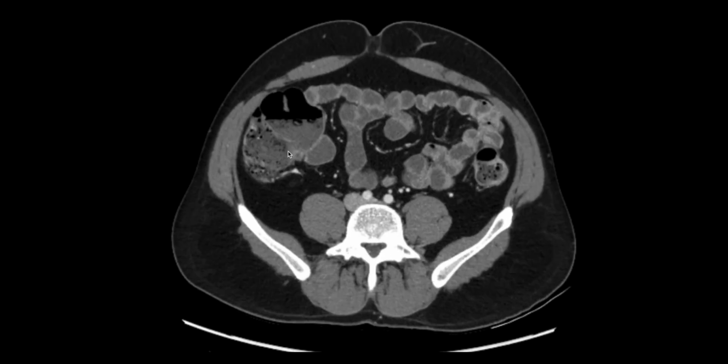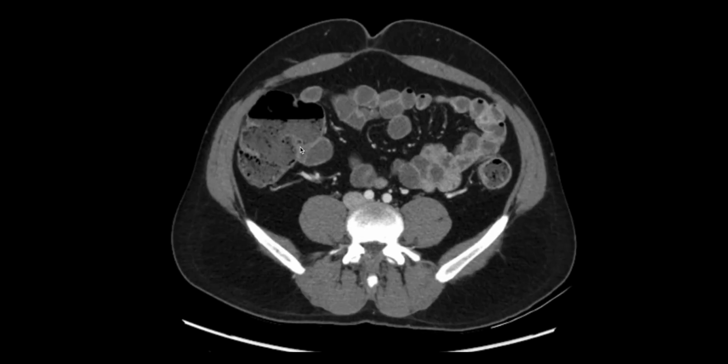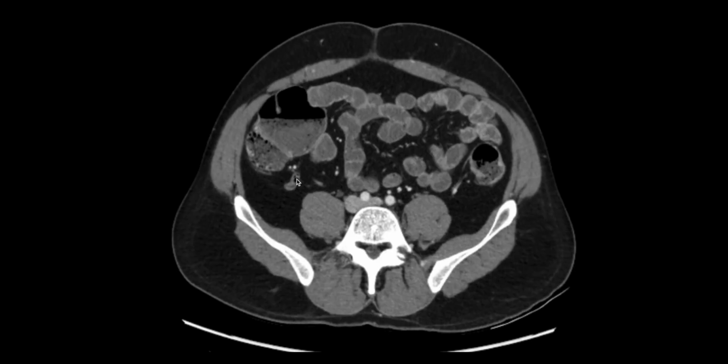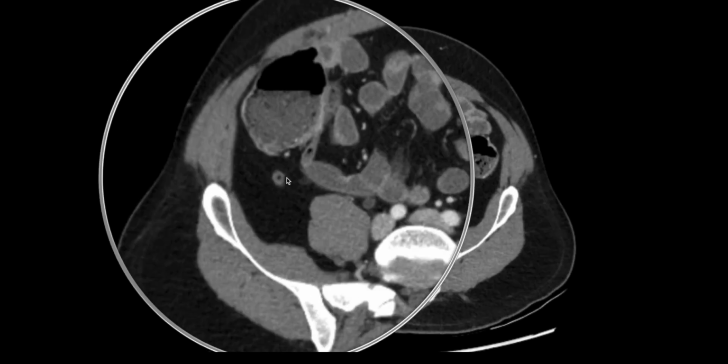And as you find the cecum, you'll notice distal small bowel, accounting for the terminal ileum, the ileocecal valve, which is a little hard to see here, and if you scroll carefully and look, you'll usually find the appendix at this point. Here the appendix has a small amount of air within the lumen and is normal.